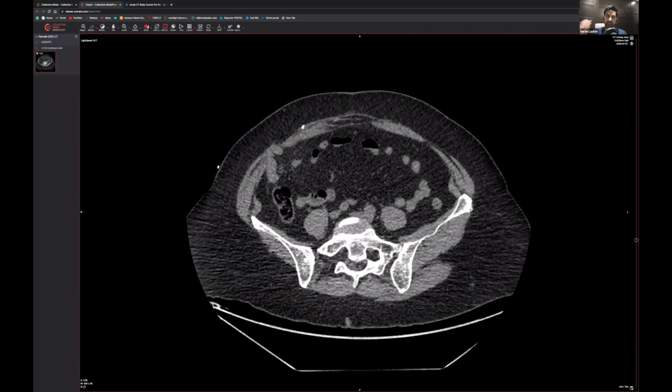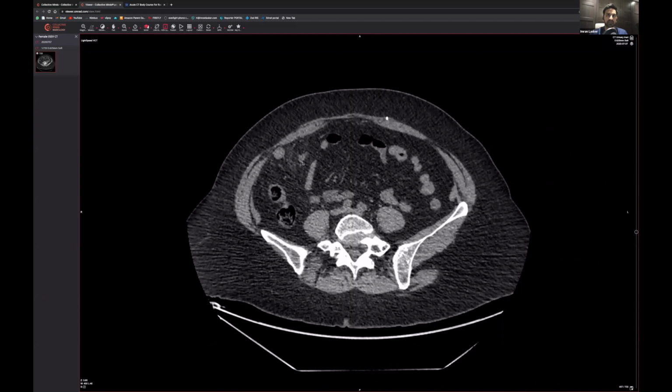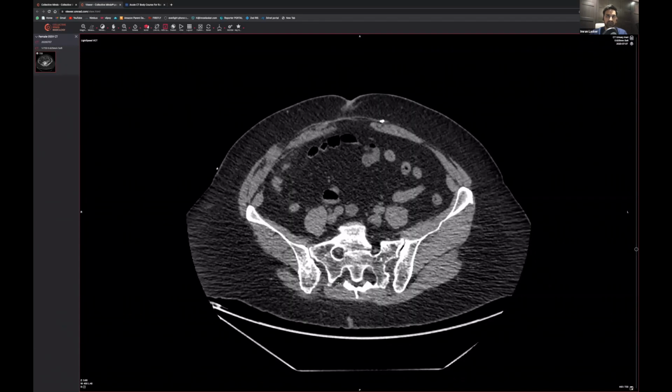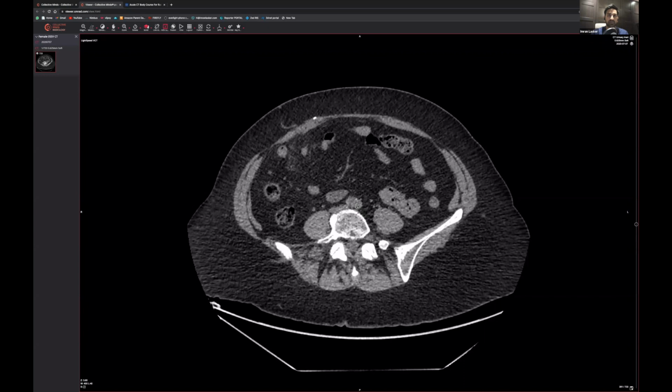And if it was incarcerated, then you'd expect there to be small bowel obstruction that way or that way, but there isn't really much in the way of compromise of that small bowel there. What you actually have is what looks like inflammation of the appendix and slight thickening of the appendix. So I would probably say there's more likely to be an appendicitis.